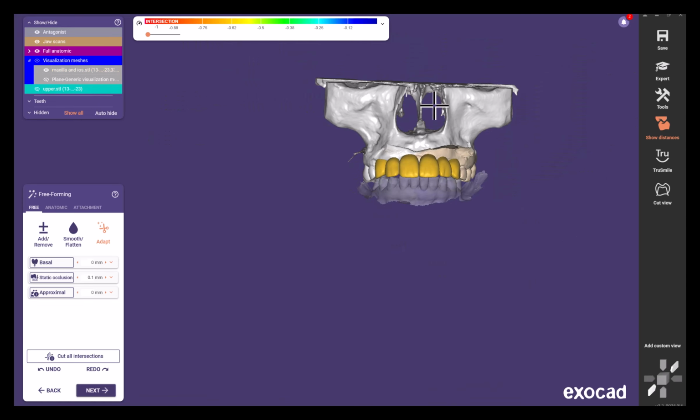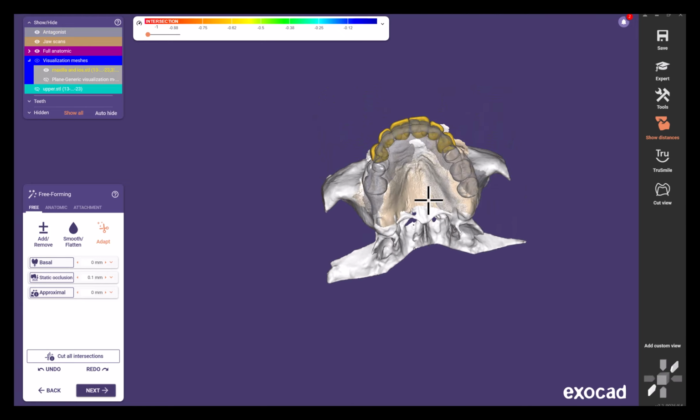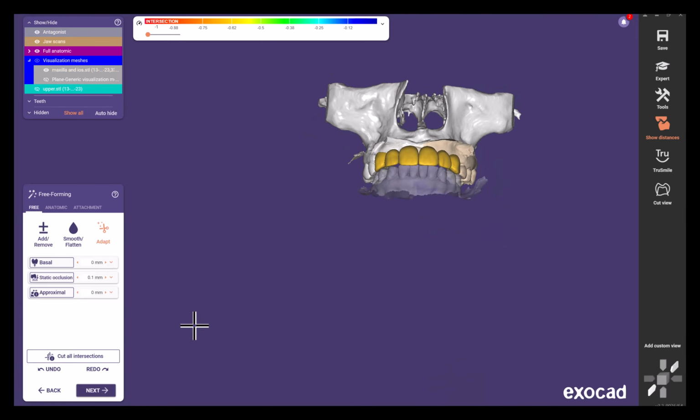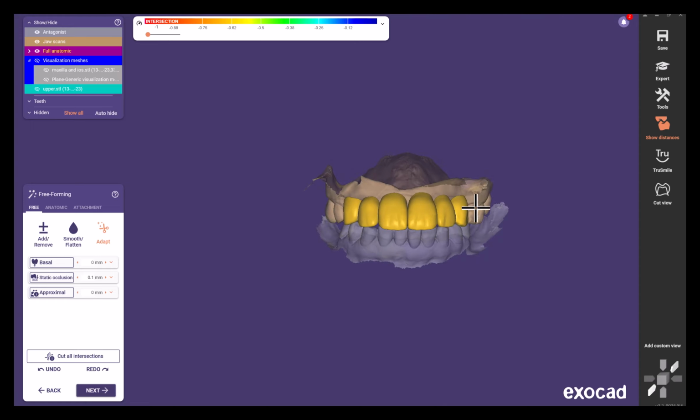And again, my best guess at a midline is pretty close. Overall occlusal plane is close. It's symmetric enough to this. And so this is probably the best I can do with the information that I have right now. Okay, so now the challenge is going to be getting this back over into Blue Sky Plan.